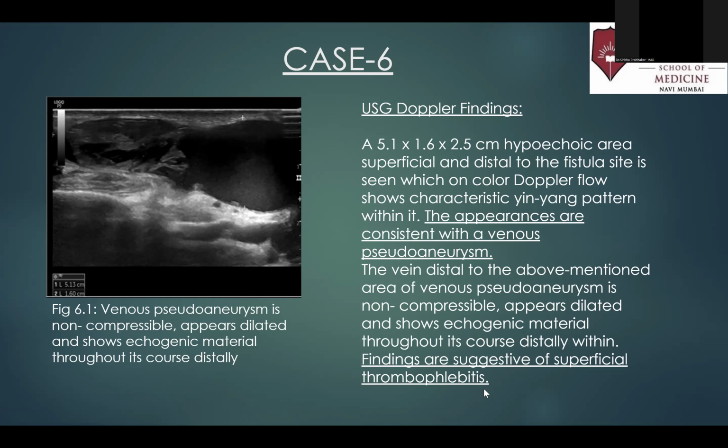So this case was an example to show that in patients with AV fistulas, multiple complications can coexist, and this teaches us to always perform comprehensive evaluation beyond the immediate fistula site. One problem often leads to another downstream.